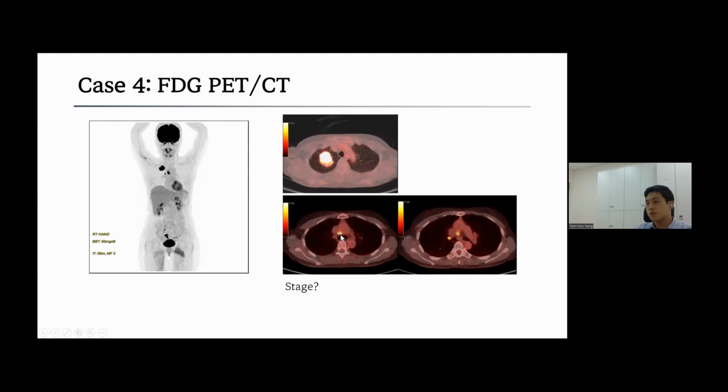This lymph node is classified as 4R because the center of the lesion is above the arch of the azygos vein, even though it seems somewhat ambiguous in this image. So the metastatic nodes are observed in the ipsilateral mediastinum, and the stage is suspected as T2a N2 M0.